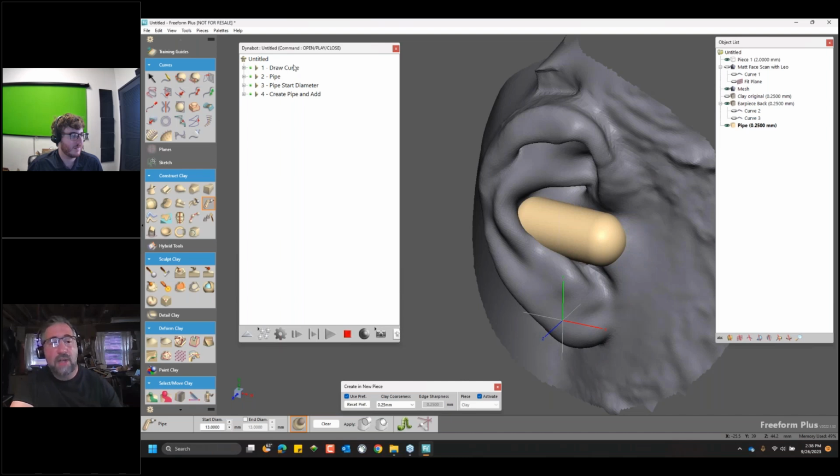You can see that as I am performing all of these actions, these steps are being recorded here in the script. When I stop, I can go back and look at the values, and this is how you can edit them, you can refine them, you can make it so that these are going to drive the workflow that you're going to do later and remove a lot of headache and a lot of confusion, not to mention for documentation and for things like any type of process validation.